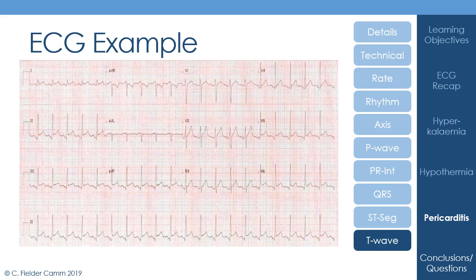And actually, the fact that there is no T wave inversion, given that there's ST segment elevation, is quite reassuring, because very often there will be some T wave inversion with our ST segment elevation. And if you're unsure about that, then go back to lecture 2 to recap.